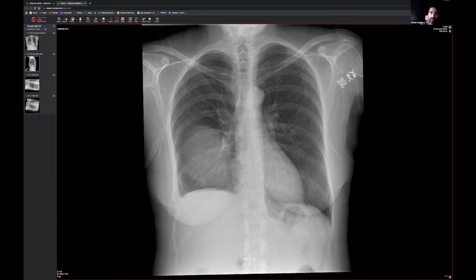Now, the other thing that people may wonder is, is this going to be a neurogenic lesion? A neurogenic lesion would be coming from the exiting nerve root foramen. So you can actually see that there's really not much in the way of involvement of the neural foramen. There's no widening, there's no scalloping of the vertebra within that region. So less likely based on these findings.